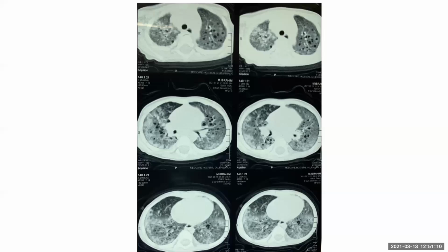I cannot appreciate any pneumothorax or pleural effusion in these images. Overall, the bilateral cystic lucencies along with ground glass haze and peripheral patchy consolidation are more in favor of some infective process in this young patient.